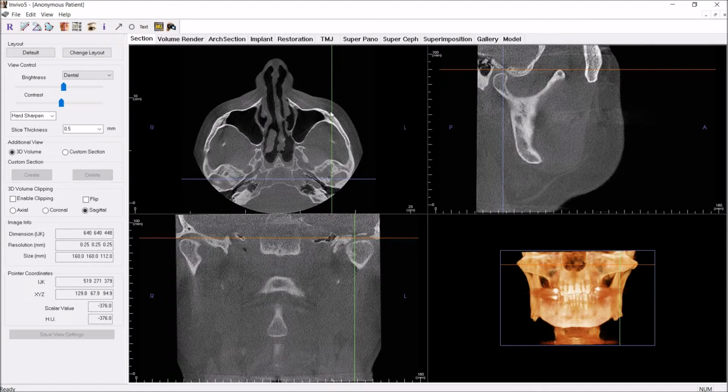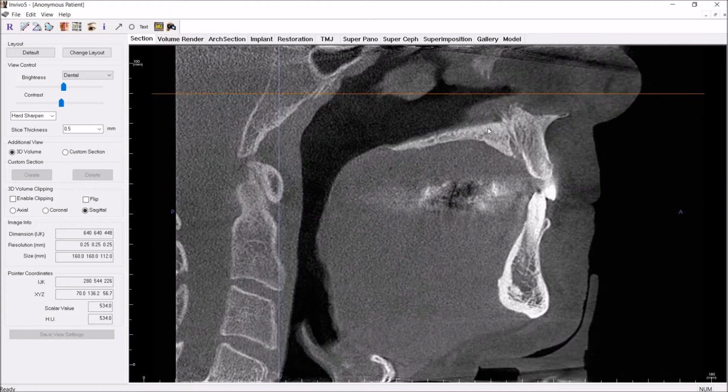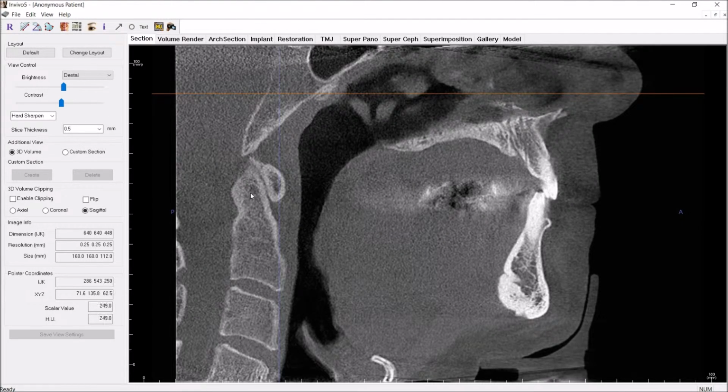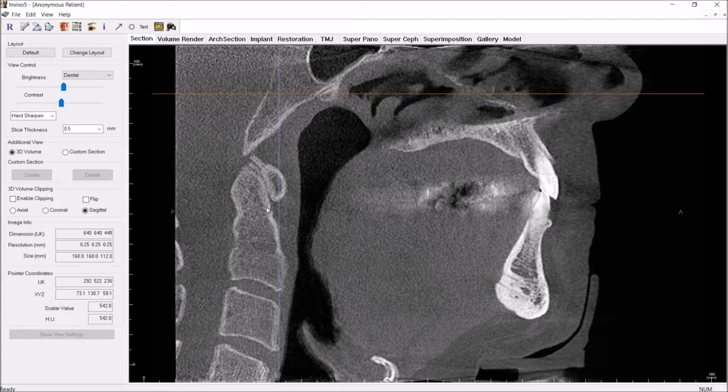And I can show you an example of that in this case, because a lot of people get this here in the cervical spine. They get osteoarthritis as well. And so you want to count your cervical spine. The first one, C1, is known as the atlas. It's just a ring shape. So here we just see the anterior arch of the atlas. And this little projection is not normal. That's an osteophyte formation. And looks like a little bit of one as well on C2.